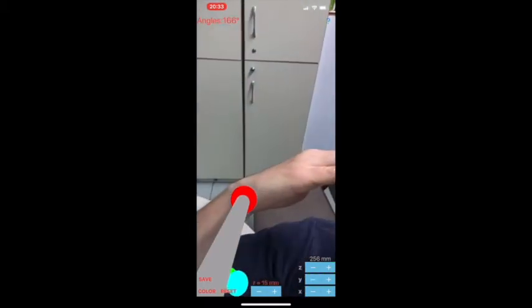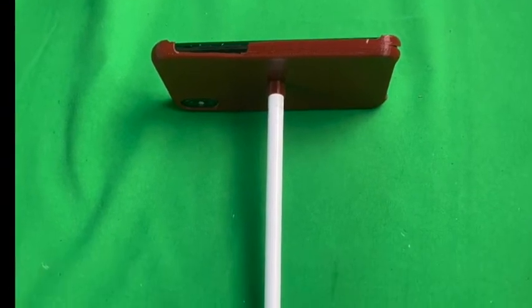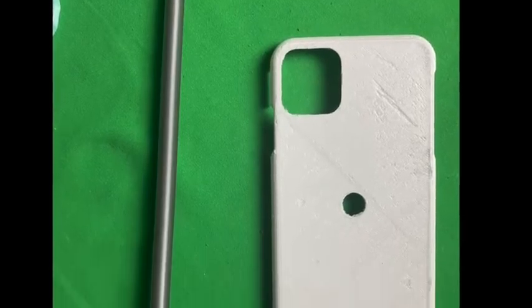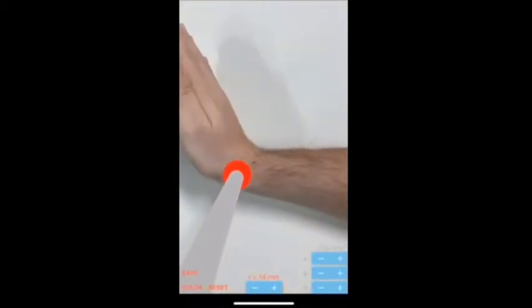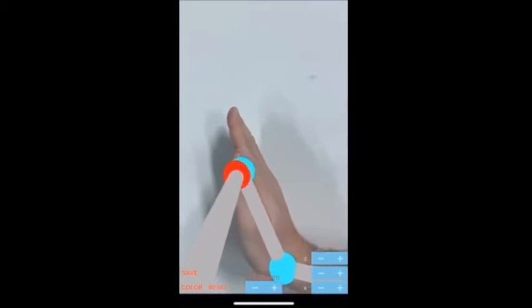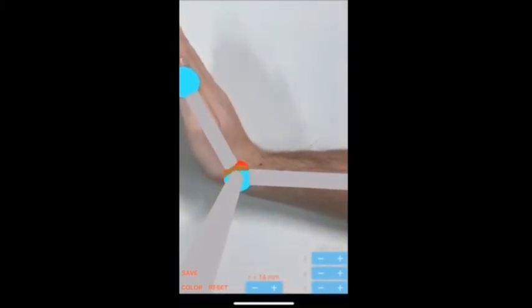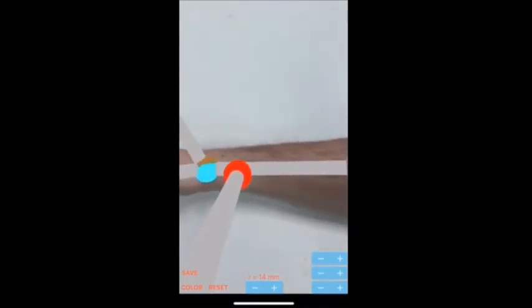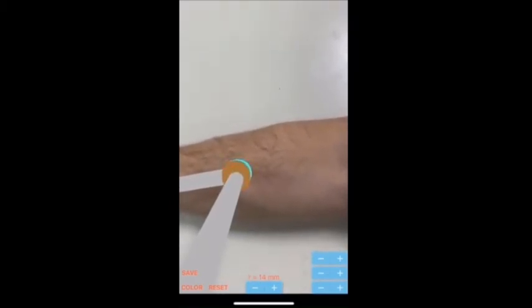In case the user needs to measure the range of motion more accurately, the following method is offered. First, the case iPhone probe tool, SIPT. A device dedicated for surface registration should be 3D printed after downloading the appropriate 3D files according to the user's iPhone model from the developer's site. The device consists of the case, in which the iPhone sits, and the rod. The rod has a predefined length, 25 cm, and is attached perpendicular to the phone's case. The other side of the rod acts as the mechanical pointer tip location.